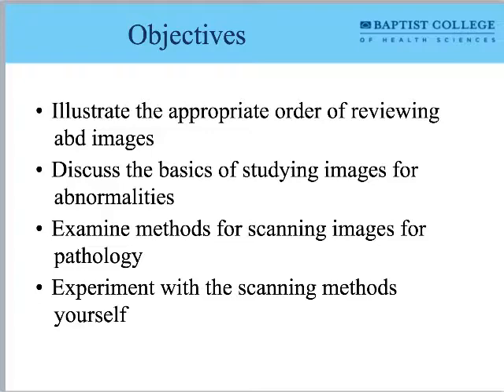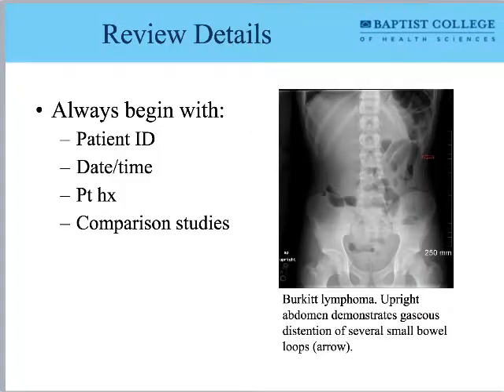It's very simple. We'll discuss the basics of studying those images for abnormalities, examine some methods for scanning those images, and then we'll experiment with some of those methods ourselves. So, very first thing we want to do is review for details. We'll always begin with patient ID, date and time. So the physicians, just the same as us as technologists, are going to begin with those basic details.